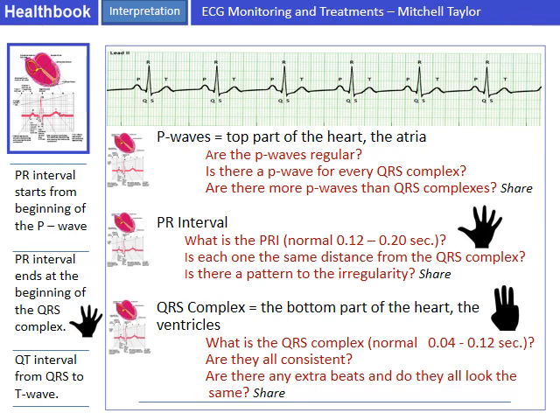Now if you want to go with 0.20 or 0.16, that's your prerogative, but we'll want to get it as close as possible, so that if the next person sits down and does it, they would get closest to what we're getting. So as close as I think we can get would be 0.18, where we're dividing half of a box to start out with.